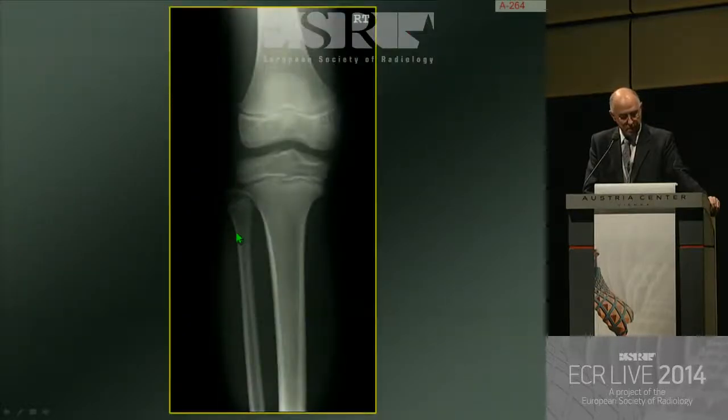That is what we mean by it. So to put the basic knowledge that we've discussed in context, I'm going to show you this case. This patient is very ill. He's got a very high fever, and yet his plain film of the area, which is swollen clinically and very, very tender, looks, for all intents and purposes, as normal.